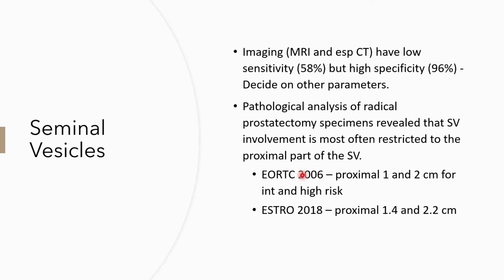So we are now going to discuss the seminal vesicles. We are going to discuss all of these theoretically, but then we are going to take a look at some of these on a demo case.